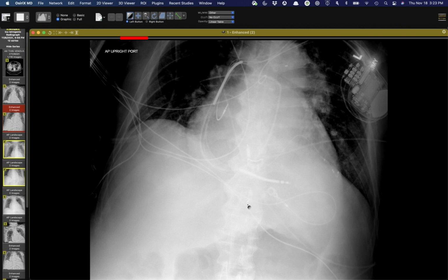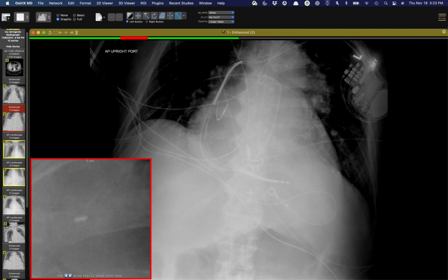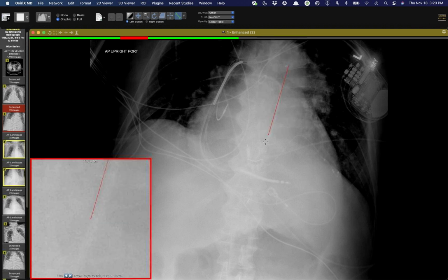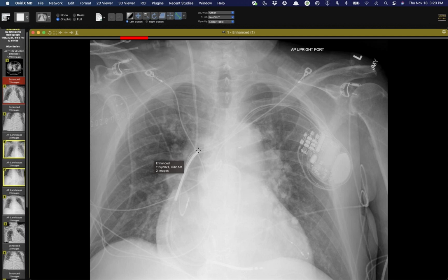And you can, in this case, actually see the distal portion as well, which is why I include both of these. Now, I think the smallest balloon pumps that we have here are 23 centimeters in length. Most of them are like 25 centimeters. And what's frustrating, and you may see the same thing, is they usually just report them in terms of the volume of air that they hold. So this is a 40 milliliter one, which of course is then influenced by the diameter, how long it actually is. But you can see if you just measure a straight line, it's only 20 centimeters. So that's too short. So something is not quite right here, at least makes me a little nervous.